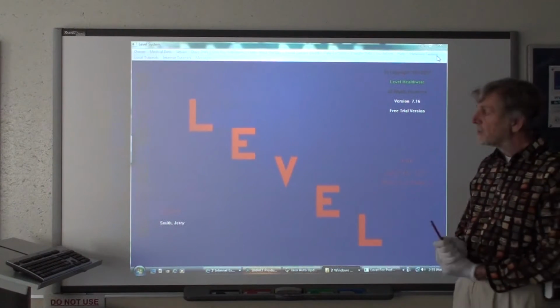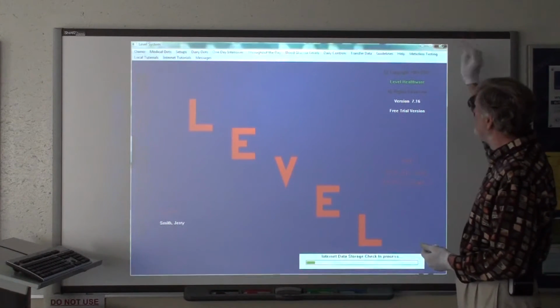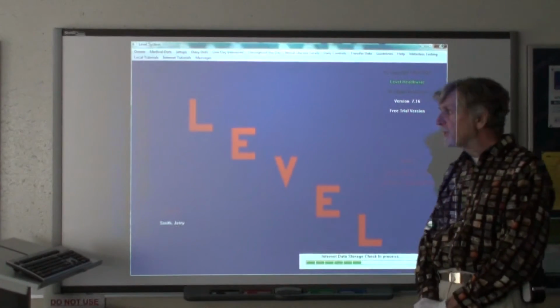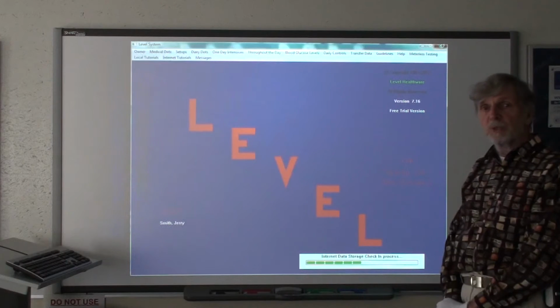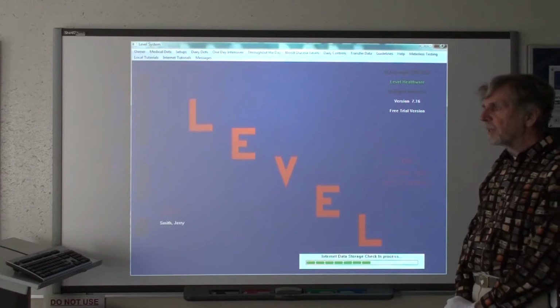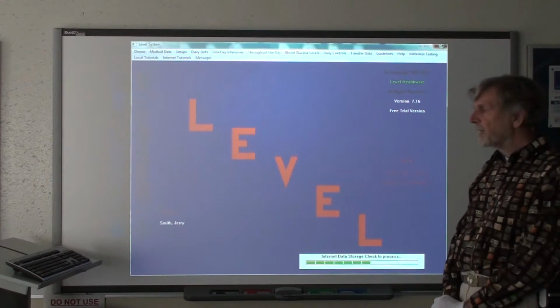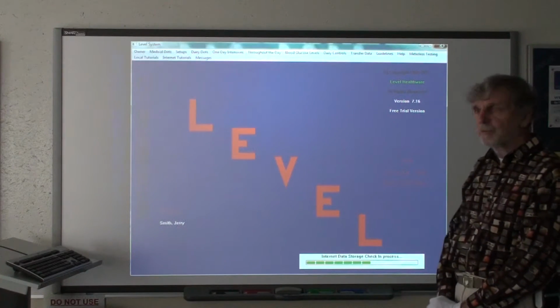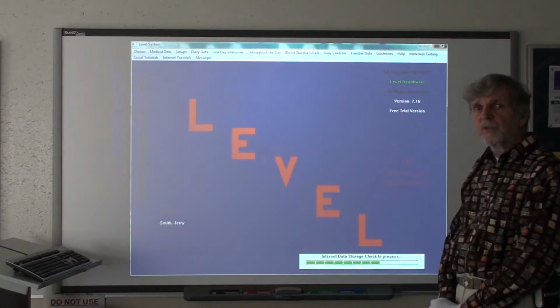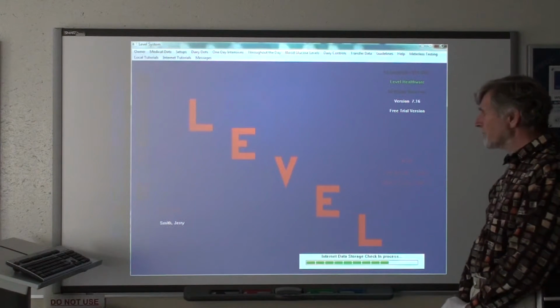So let's close Jerry Smith down for the moment now, and we will check in to Internet Data Storage just in case that you had put a message there. It would now be checked back in, and when Jerry Smith made the next checkout, then he would have that message visible to him to look at, or any other entries that you might have made into the file for him to actually take a look at.